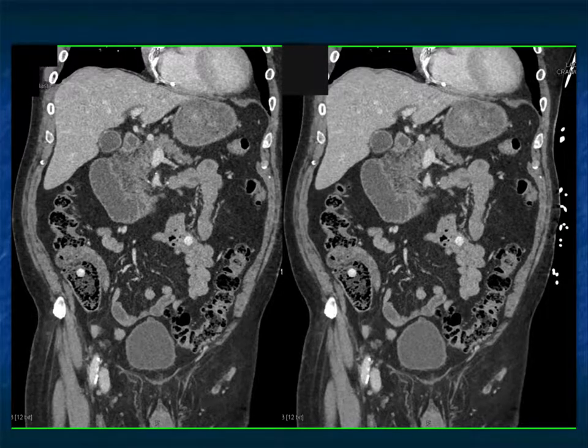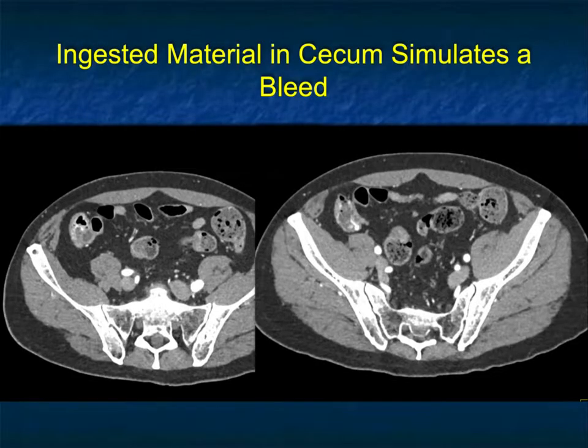This rounded thing is typically associated with ingestion, whether it's pills, be it vitamins, or otherwise. It's always going to be foreign matter.